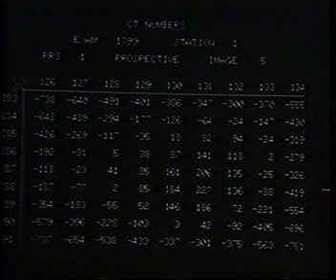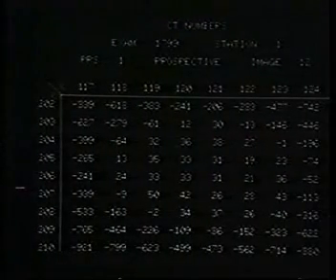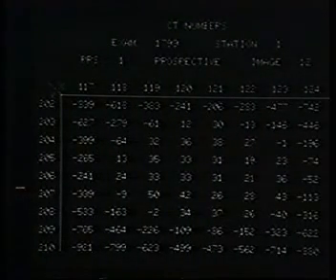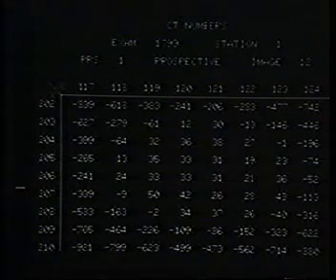Again, we tend to use 200. But if we look at numbers recorded from the phantom nodule, they're all in the 30s. So this nodule is indeed denser than the phantom. Therefore, we can call it calcified, and indeed it has been followed and is unchanged.